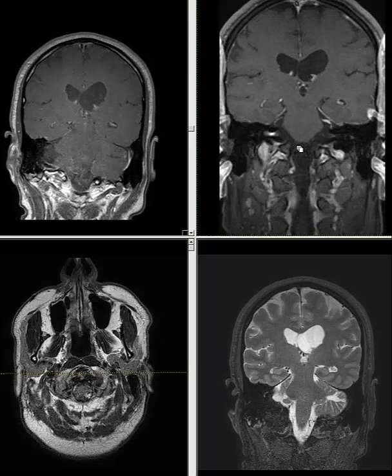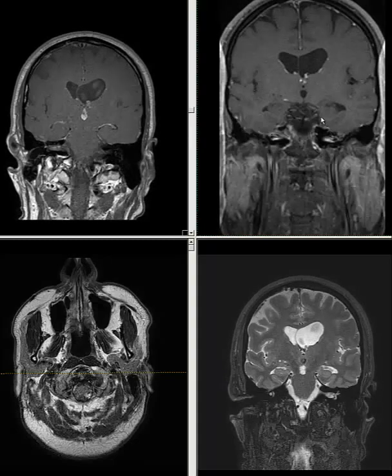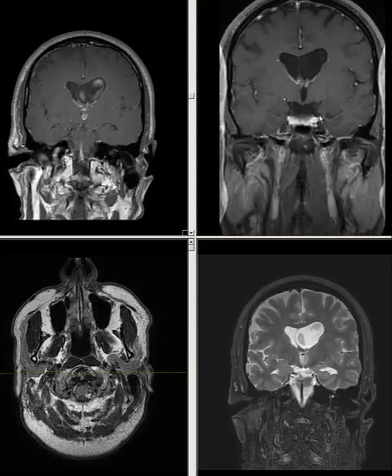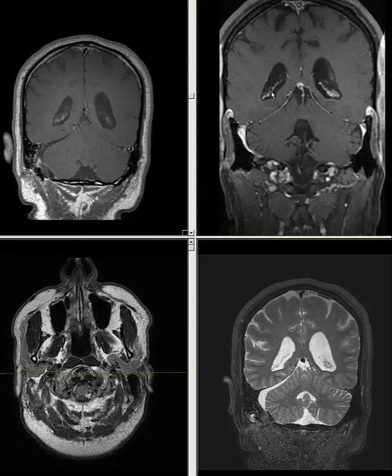The surgery went fine, but the problem is the patient developed a headache after the surgery in August 2012. Now it's December 2012. The patient's headache is worse when the patient lies down. When the patient is standing up, the headache is better. So we can take a look at the images on the previous study. The patient has a relatively larger left lateral ventricle as compared to the right side.